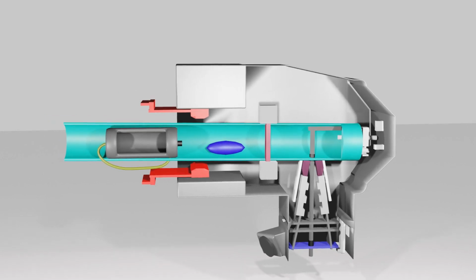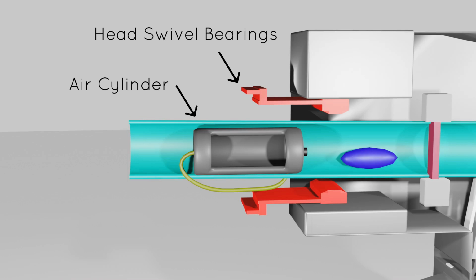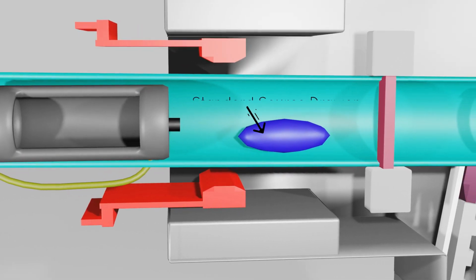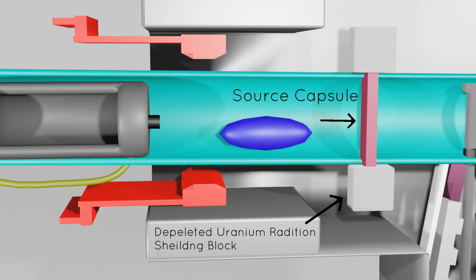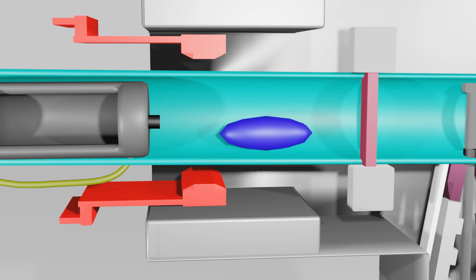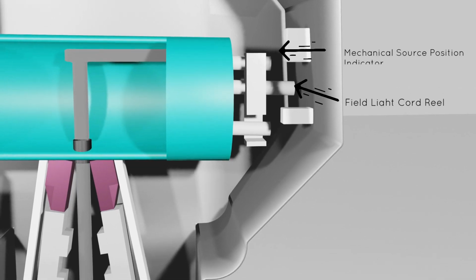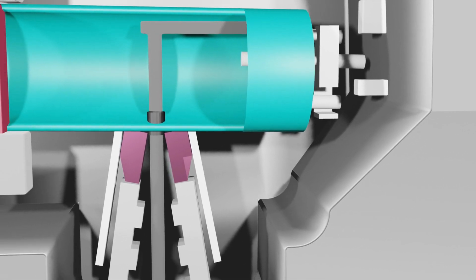The point detector technique usually consumes a lot of computer time, but also achieves better precision. A default cross-section library is used for the photon tally, and the code reads the cross-sections automatically from the Photon Cross-Section Library, MCPLIB22. The Cobalt-60 source emits 2 photons per disintegration with energies of 1.333 and 1.17 MeV. The animation shows a two-dimensional plane of the described model as given by MCNP4B in an irradiation position, where the source appears inside the tungsten shield surrounded by a thick shield of lead.